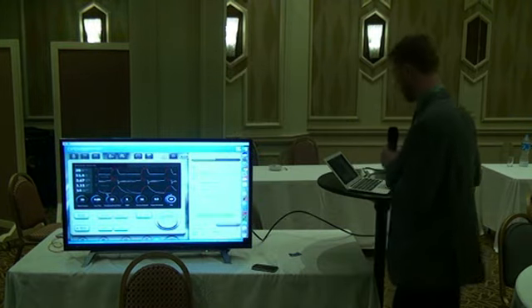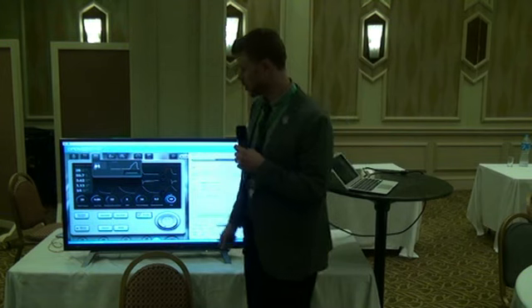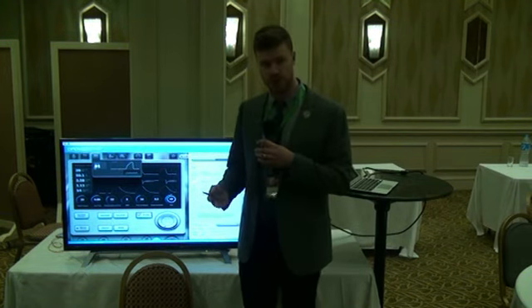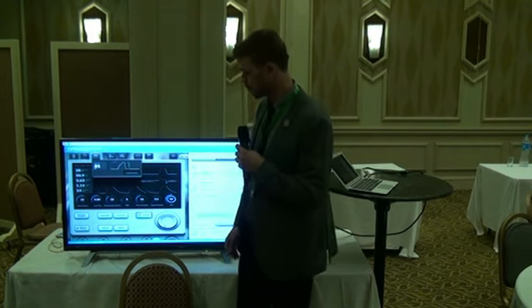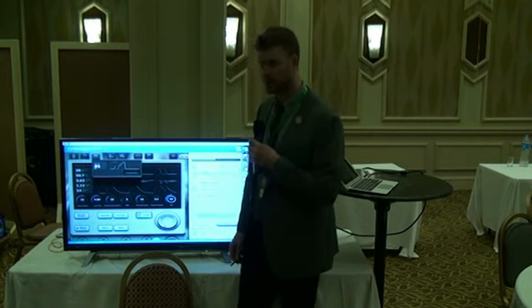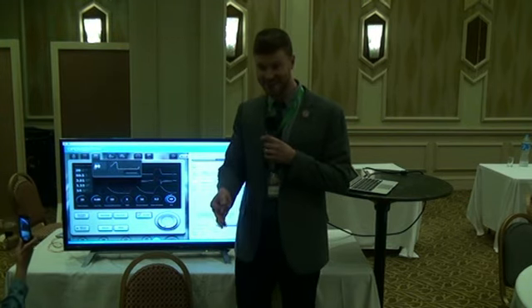Let's look at the capnogram before we go on. So I know this is all brand new for you guys, and my understanding is that you don't measure end-tidal CO2 as a standard of care. But what does that look like to you? Good or bad, or what do you think is abnormal? So it's definitely not right.